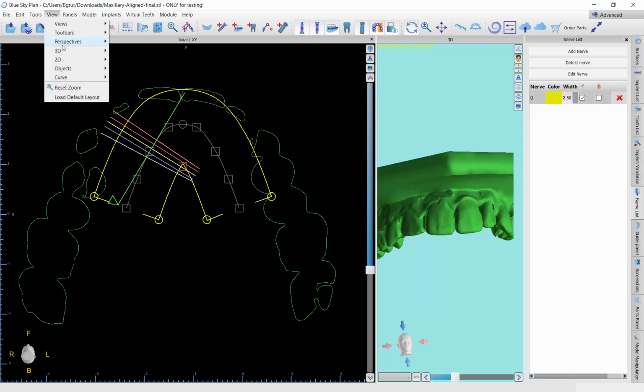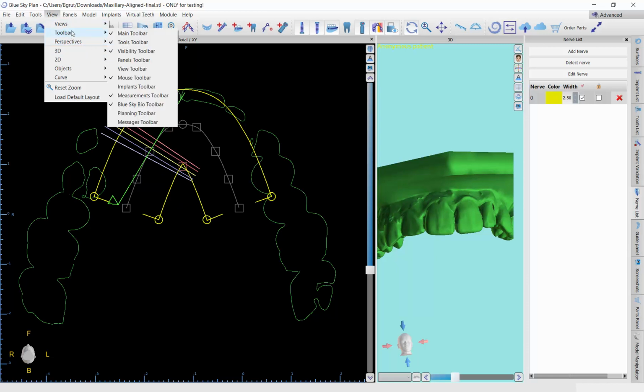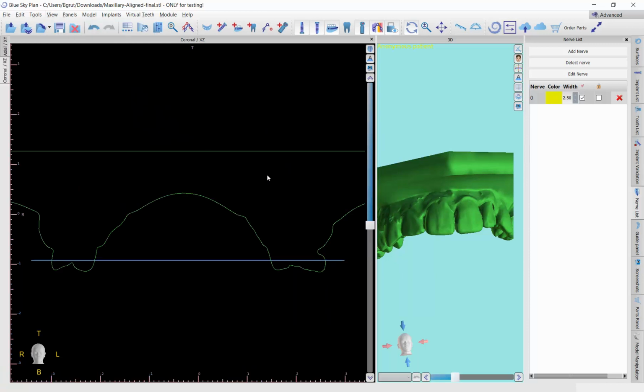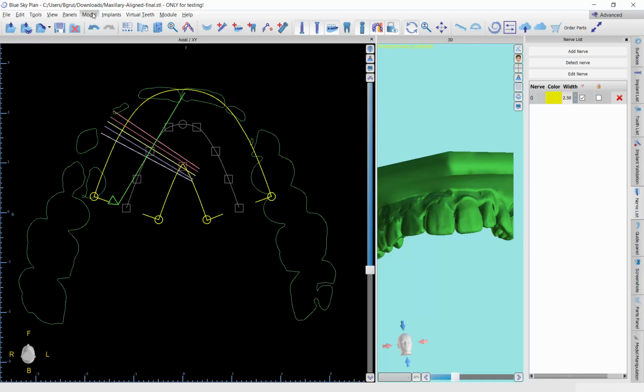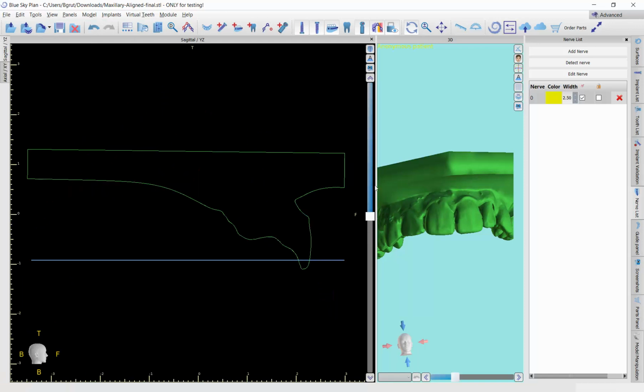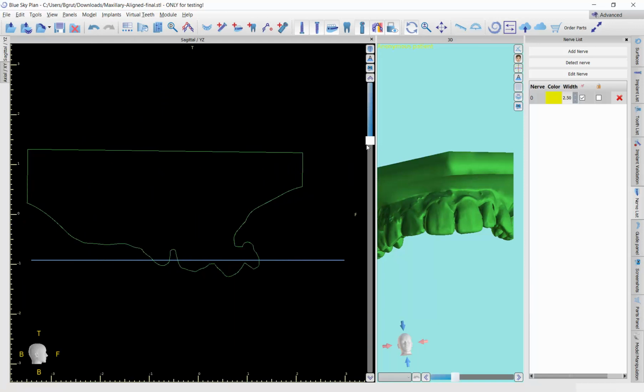First of all, if I want, I can actually go to... sorry, I'm used to doing a typical one with implants. I would use the F3, which has all the slices, but since it's an STL, it's not doing that. So I could also show the coronal, and just to get an idea, you know what, that one's probably not great. Let's view the sagittal, because now it's pretty much level throughout the teeth, this cross section.